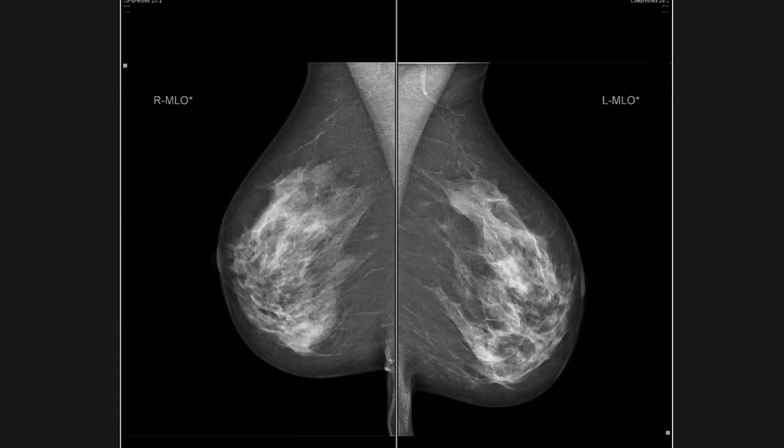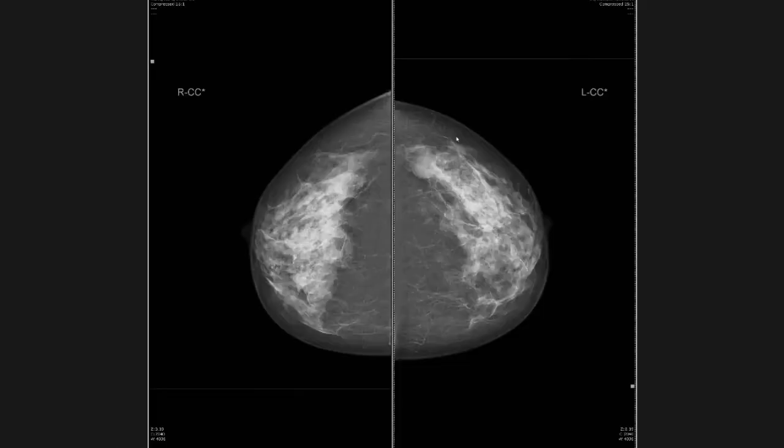And what would you normally like to see in your usual practice mammogram? So you've seen the MLO views. Pardon, ma'am? What would you like to see as well as your MLO views? Ma'am, any mass, any asymmetry, architectural distortion, axillary lymph nodes. Okay, I've got the CC views for you now as well. Yes, I want to see the CC views as well.